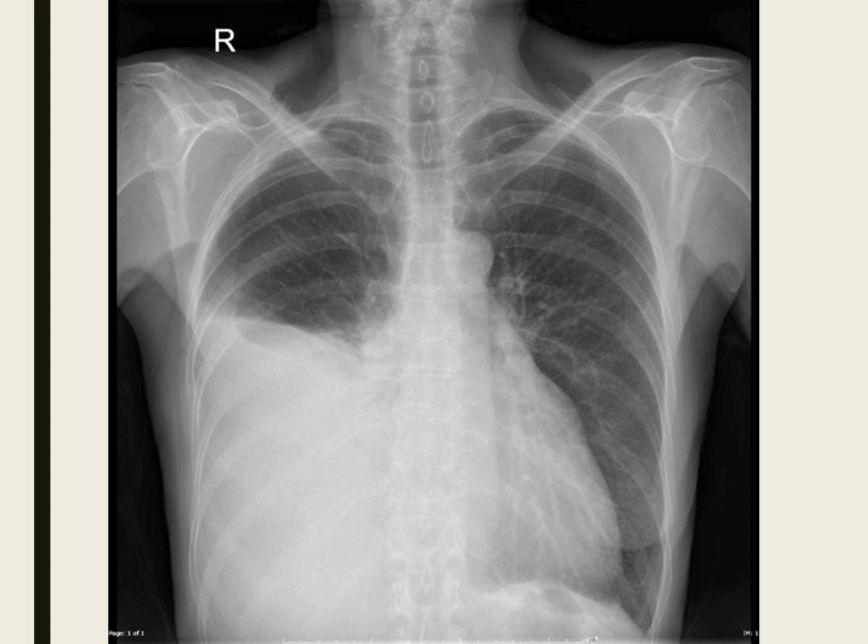B, anything funny about bones here? Clavicles look okay, symmetric. The vertebra look pretty straight up, I don't see any big fractures in the ribs. Okay. C, heart. The heart goes from here to somewhere there, looks a little biggish to me. No big congestion in the perihilar area or anything like this. D, diaphragms. So you can see this diaphragm mostly, but you don't see this one, right? And there's obviously this stuff.